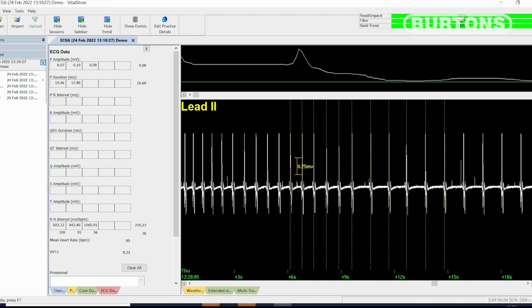So what happens there is, this is the area where I clicked. These are the 10 highlighted points to the right of that data. We can see there's a fair degree of variation there, so we're expecting our VVTI to be fairly high, and indeed we've got a VVTI index value of 9.33. Okay, the larger that value, the greater the variation, and it's a logarithmic scale, so it's not a linear increase, so 18 is not twice as variable as 9, it's many more times variable than 9.3, and the closer we are down to 1 or 0, then the less variability there is.